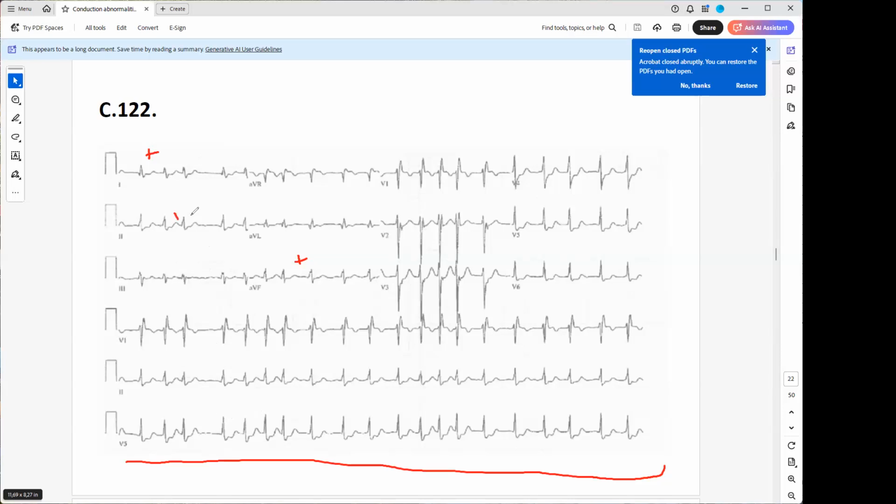This is not a P. This is a T wave. If you do have QRS complex, you have to have T wave, okay? The P should be different. If you do not see P waves here, you can say there is no P wave, all right? Because the P wave should be round, should be symmetric, and should be equal. But this is not. So we do not have P wave, okay? But this is arrhythmic without having any P wave.